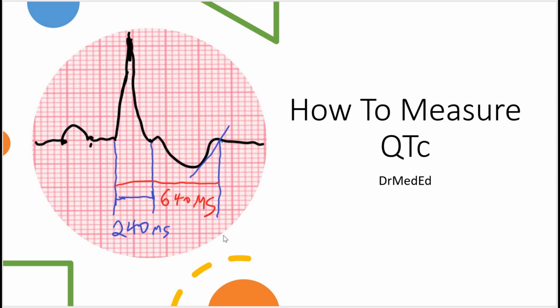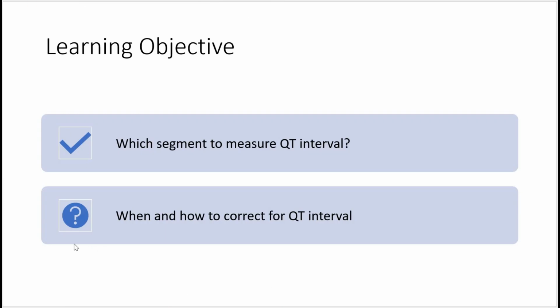Today we'll talk about how to measure QTc. We'll talk about which segment to measure the QT interval, and when and how to correct for the QT interval using Bazett's formula.